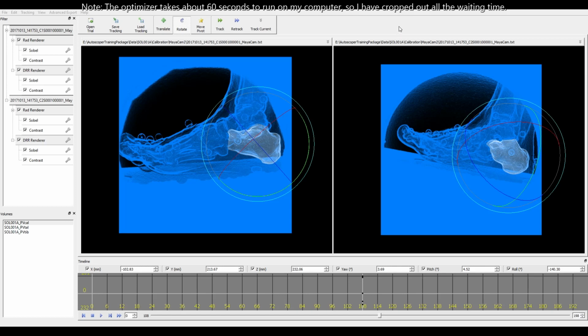So the tracking is done, and it looks pretty reasonable. Usually I'm getting normalized cross correlations of around 1, just above 1. So that's in a decent range there, so we'll go with that. And then I would normally look at another frame. I'm usually doing them in multiples of 4, just so it's easier to track the same frames across bones.